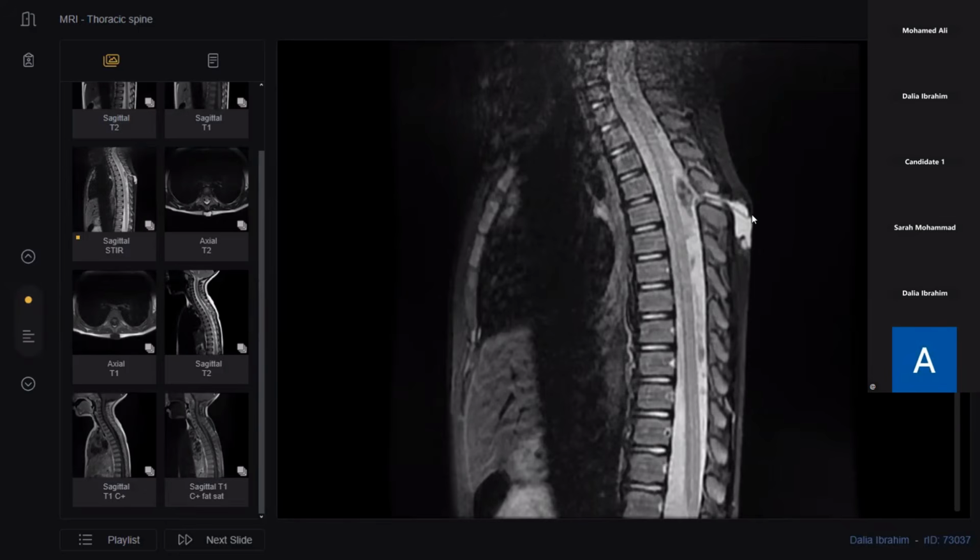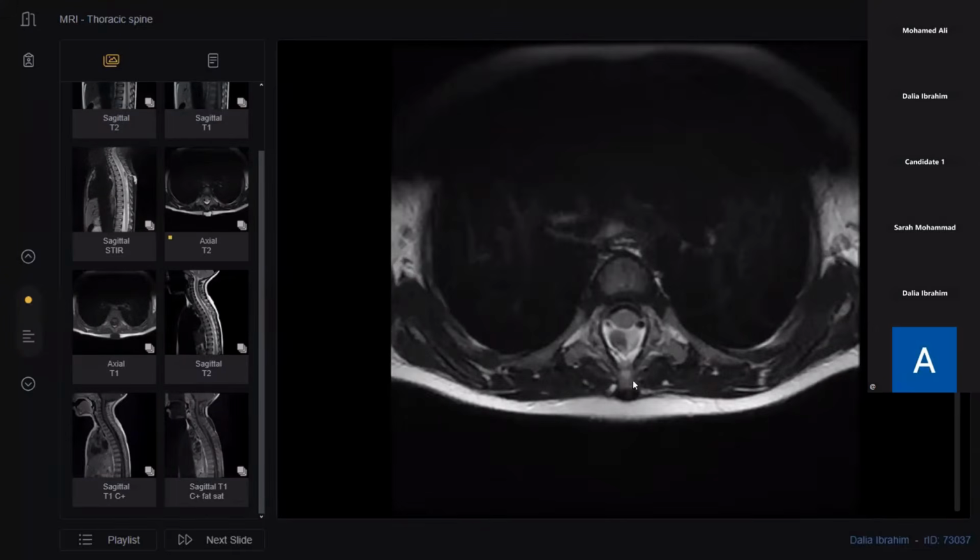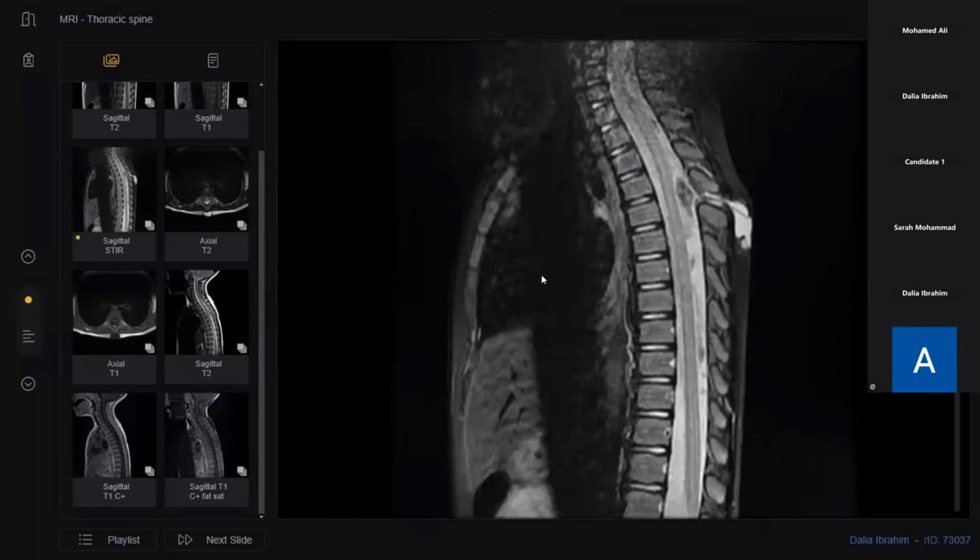Okay, but she rather described what she is seeing exactly like the pathology. This is like a fibrous tract. And we have finally subtle signs of spinal dysraphism in this case, like widening of the interspinous region at the site of entry and the incomplete fusion of the posterior neural element at the level of T4 in this case.